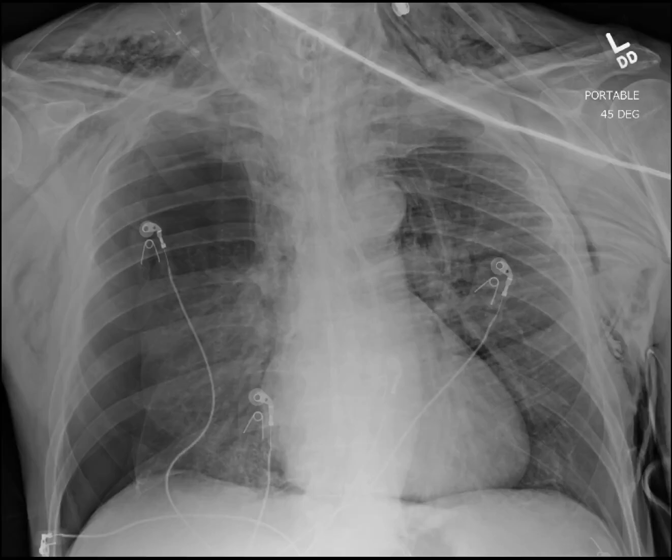All right, so this is a chest x-ray of a man who is in severe acute distress. This is an incredible case that was sent to me, and there are so many very important teaching points here. So let's go through and break this down and extract as much information as we can. Then I'll shed some light on the clinical context, the clinical picture, and I'll tell you exactly what happened.